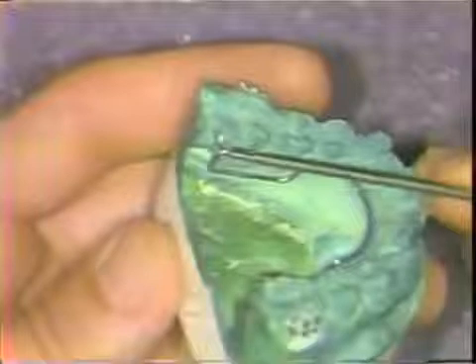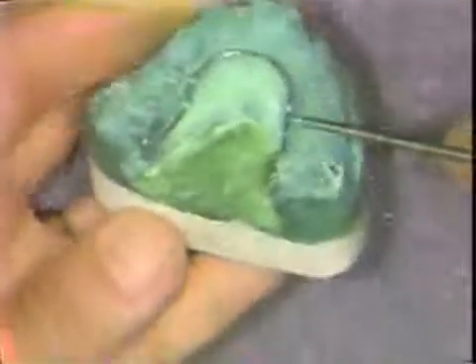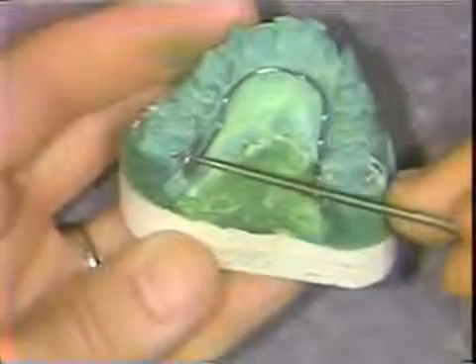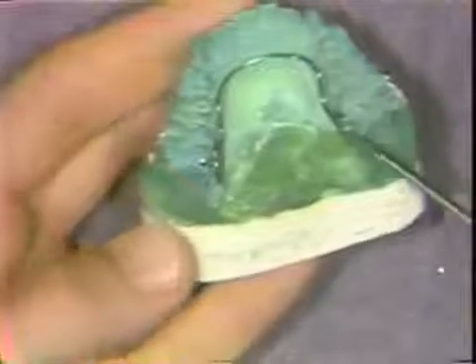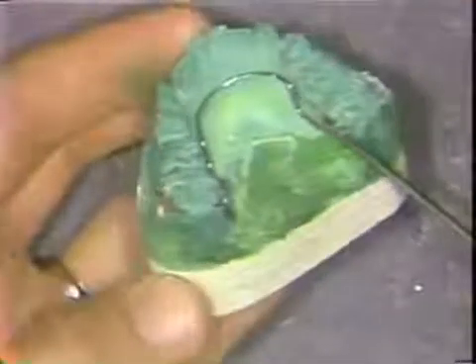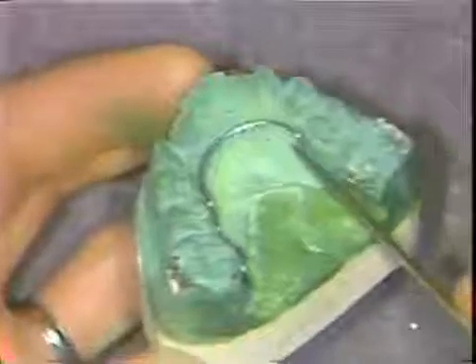Its insertion is a distal entrance. It is fully adjustable in that it can be contracted, expanded, and torqued in full 3 planes of space. It serves anywhere along the arch for the addition of auxiliaries, and it can be used in conjunction with conventional orthodontics.